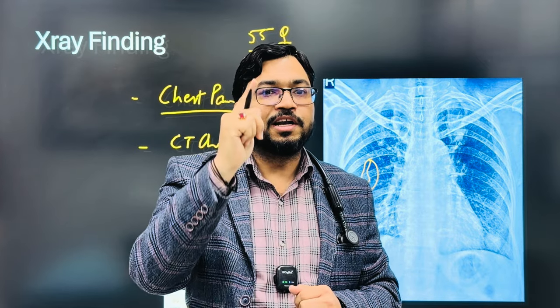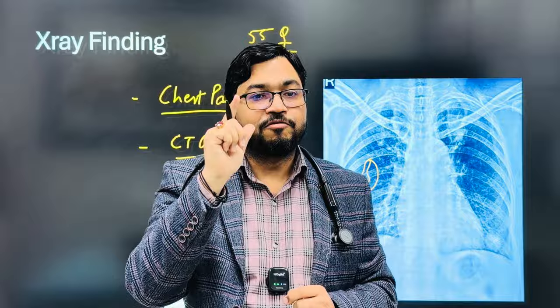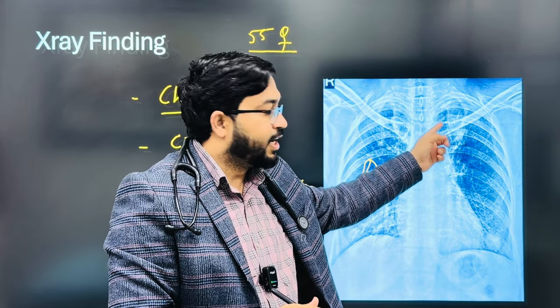You will definitely find important pathologies, and the most important diagnosis of malignancy we usually find in the apex, hilum, and diaphragm.